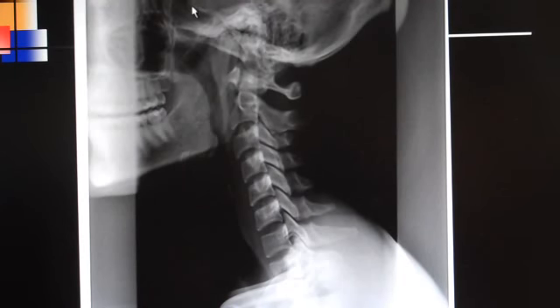On this film right here would be the sella turcica, and the sella turcica has two measurements. The first measurement is from anterior to posterior across at the widest part this way, whereas the second measurement is the S2I measurement. And my mouse just went away. Let's see if I can get that back. From S2I, from the superior to the inferior aspect.